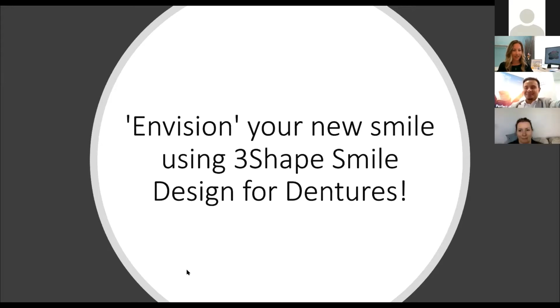Thanks, Eric. Hopefully everybody can see my screen okay, and you can hear me clearly. I just wanted to come on today because I am aware that a large percentage of people who own TRIOS don't use the Smile Design application. And specifically for dentures, I feel like we're very fortunate to have the clinical and technical background to utilize this and share with patients what they can expect when we're treating them for new dentures.